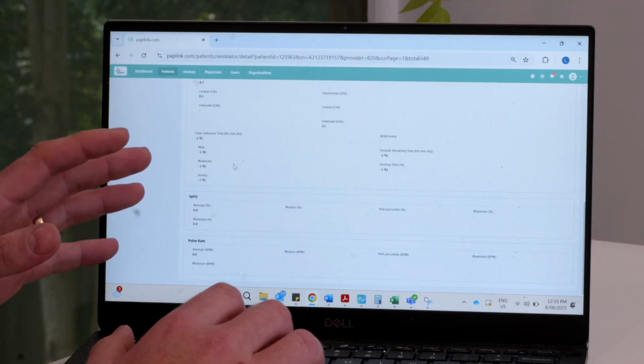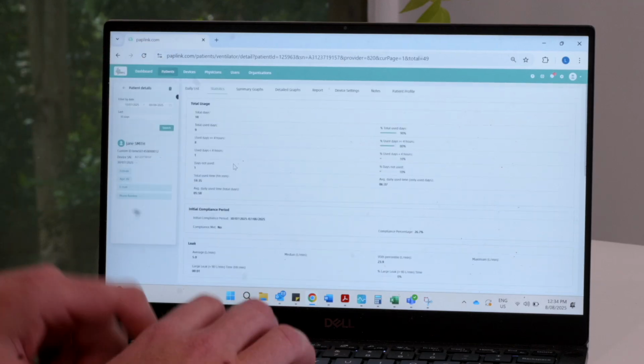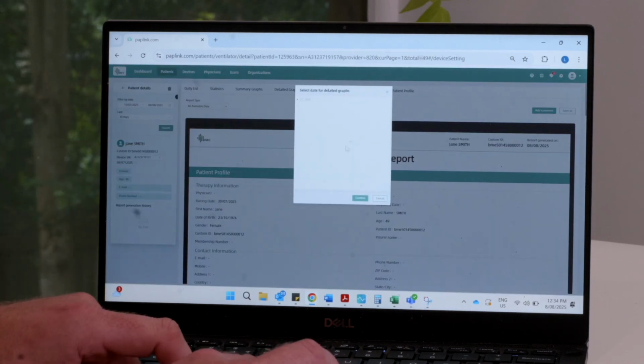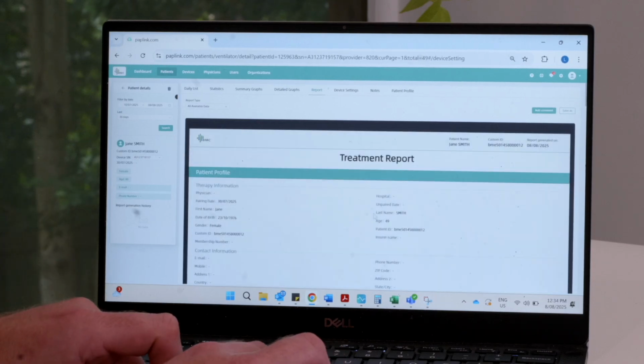If you've got the oximeter attached, you can see SpO2 and heart rate data as well as a part of that report. To generate the therapy report, click on Report. You want all available data as the data type. You can choose days of detailed data to come through if you wish, so just choose a couple there, and then the detailed data will generate on that report.